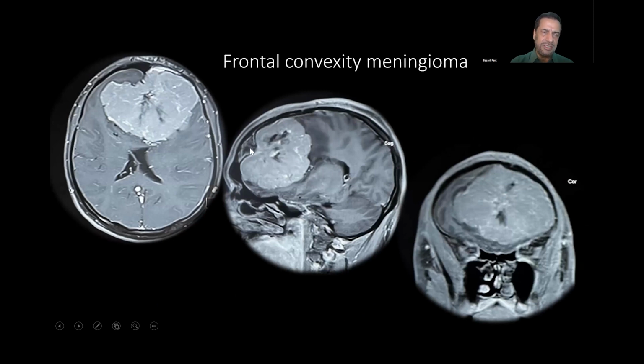So this is the main attachment from where the main vasculature goes into the tumor itself. And you can see that there is some edema around the tumor. So this has invaded the arachnoid, the pia, and then the chemicals of the tumor have gone into the brain, leading to edema. So you have to be pretty careful when you dissect out the tumor from this area.